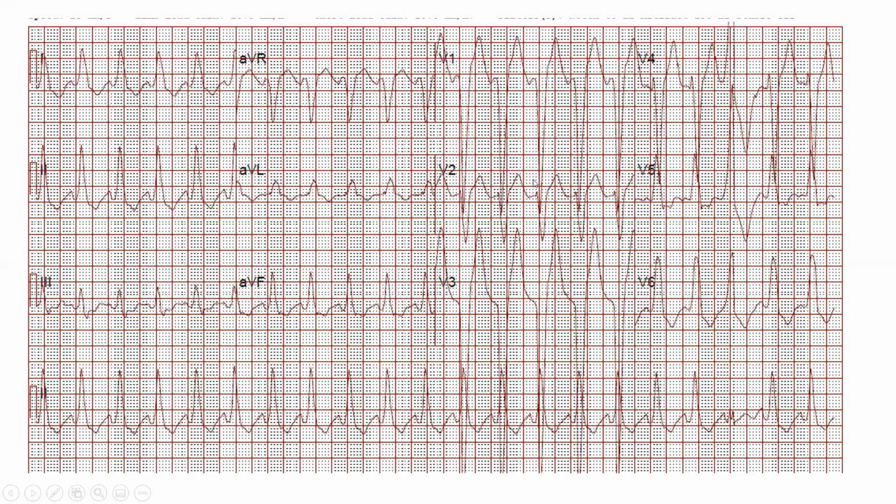So in that case, with a proximal LAD occlusion and ST elevation limited to V1 through V3, discordant to QRS, how can you tell whether that ST elevation is partly due to STEMI, not left bundle branch block? The way of telling is to look at how discordant it is. So it is discordant, but how excessively discordant is that ST elevation?